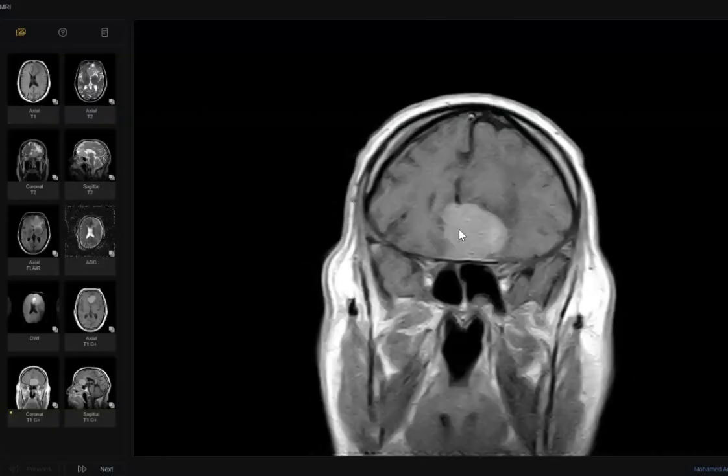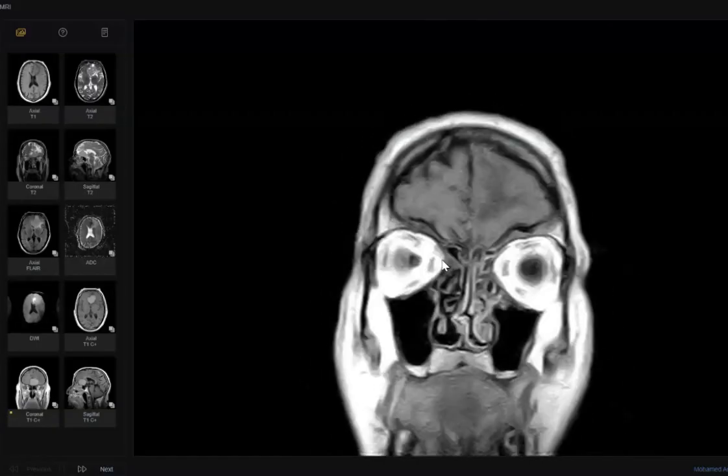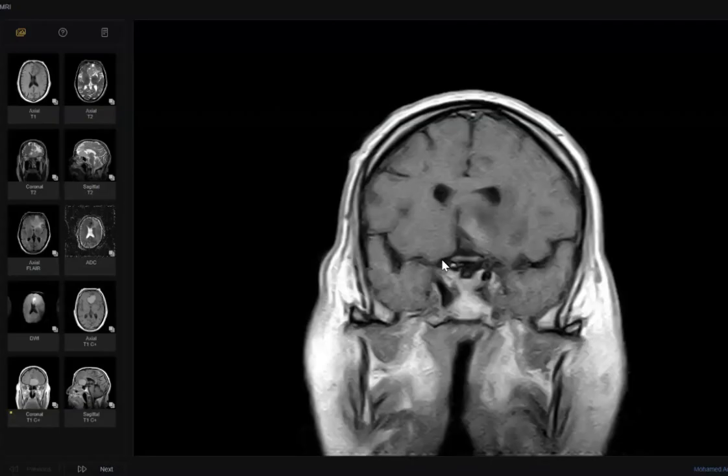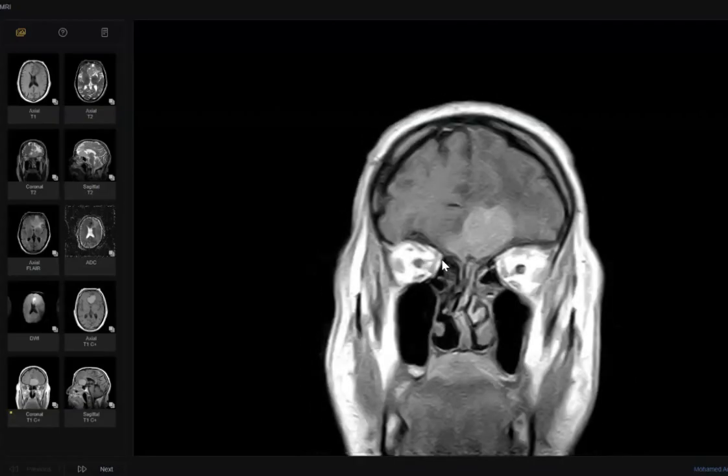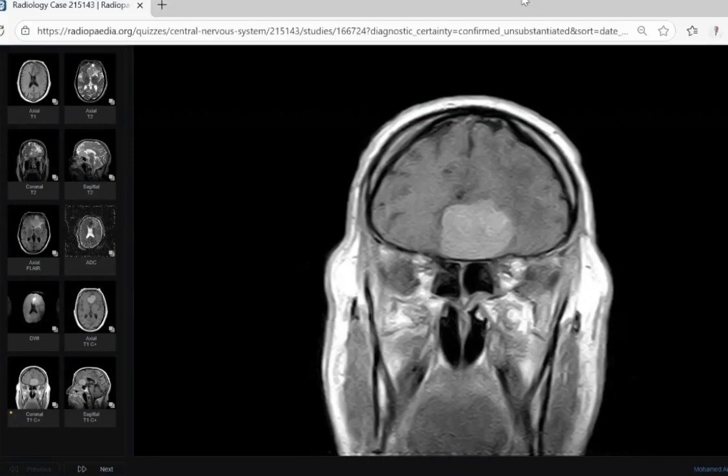See, it is inclined more to the left, and this is the site of the ACA. It may be compressed, it may increase in size, whatever happened, but this infarction is almost due to the large size of the meningioma compressing the left ACA. Thank you so much, my colleagues. Thank you, really, Dr. Nagam.